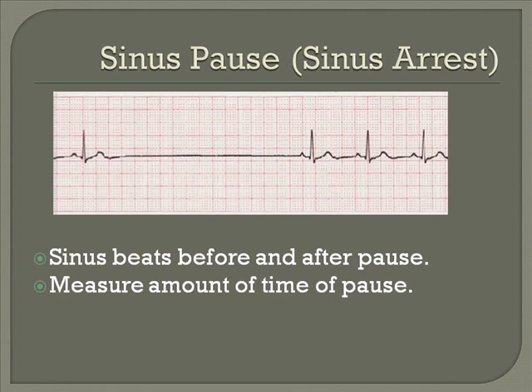The recovery from this, such as when the heart starts beating again, can be a different type of beat. But as you can see in this case, a normal sinus beat begins right afterwards. You measure out how long it is between pauses and record that.